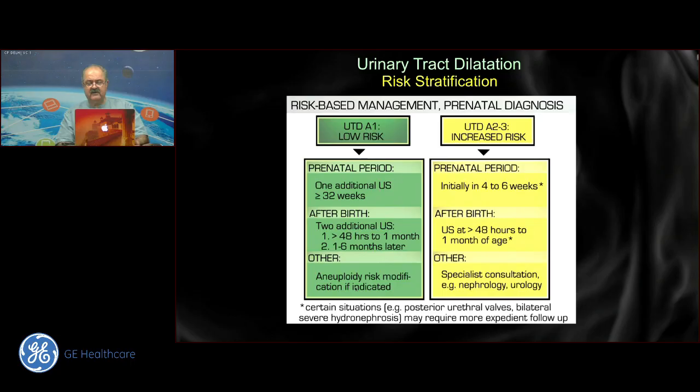Of course, if we find just a little more than 4 millimeter renal pelvis, you will look back and see what it scores on the Agathokleous score and what is the new risk when you multiply the a priori risk compared to the fact that this is a finding.